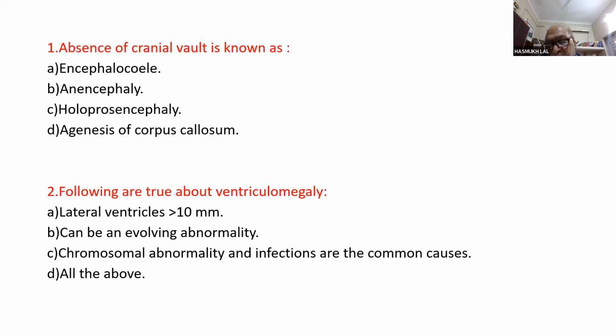And the most difficult ones are these borderline cases, unless somebody has taken the measurement of the ventricle in a very, very proper plane, like something which we call 10, because 10 we call abnormal. 10 is dilated. 1 to 9 we say normal, and 10 to 12 comes under mild ventriculomegaly. So the measurement is very, very important, and the head has to be in an axial plane.